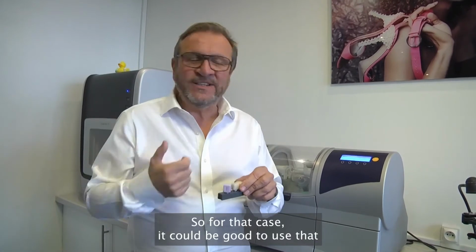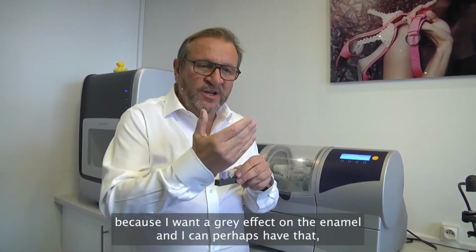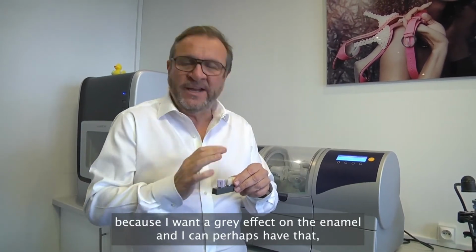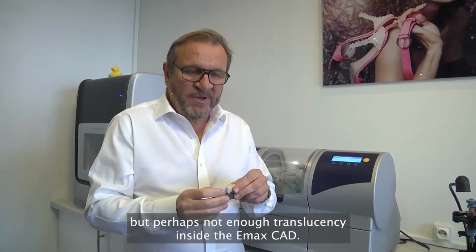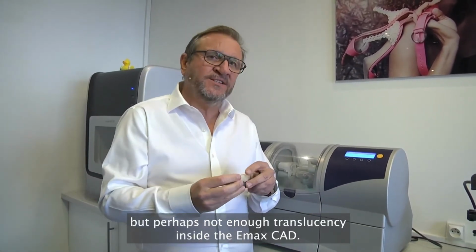So for that case, it could be good to use that because I want a gray effect on the enamel and I can perhaps have that. But perhaps not enough translucency inside the Emax CAD.